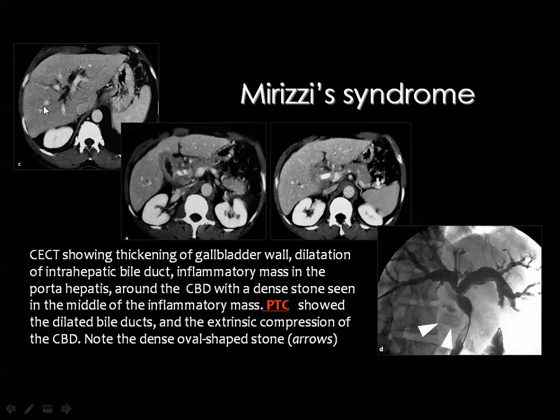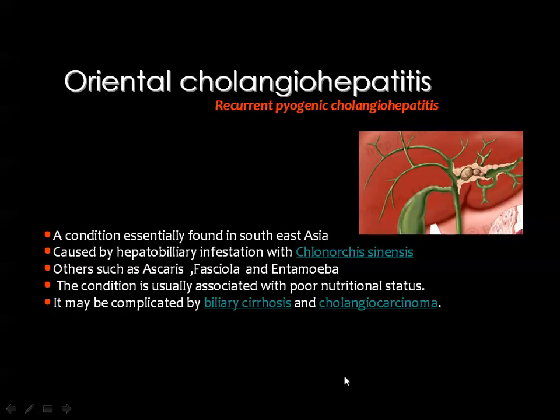Dilated intrahepatic biliary radicals, the gallbladder is chronically inflamed with a thickened and enhanced wall. Then you see the stone in the region corresponding to the site of the common hepatic duct, and it is suspected to be surrounded by some inflammatory granulation tissue representing the cause of obstruction.